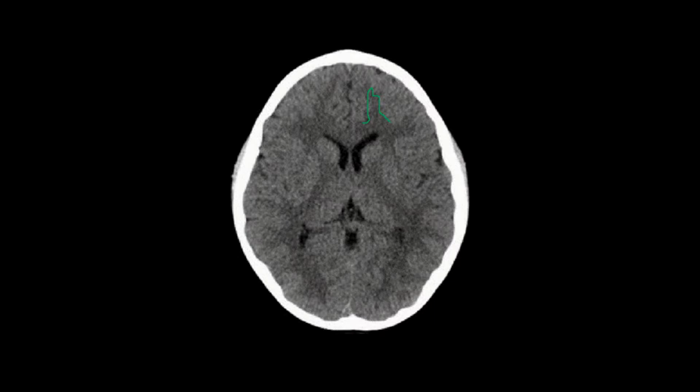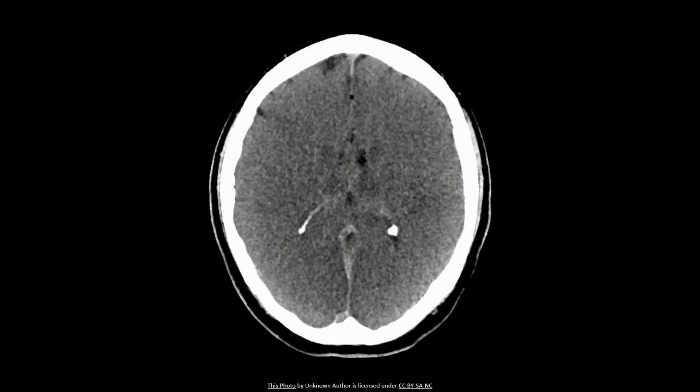So that delineates the gray matter from the white matter. If you cannot distinctly delineate this margin, you do not know where the gray matter ends and where the white matter starts, then you're looking at an edematous brain. What is striking about this image is that the moment you set eyes on it, you can say that there is no clear distinction between gray and white matter, like we saw in the previous image. So this is definitely a pathology. It does not happen normally, and in this particular case, it's because of a generalized cerebral edema.